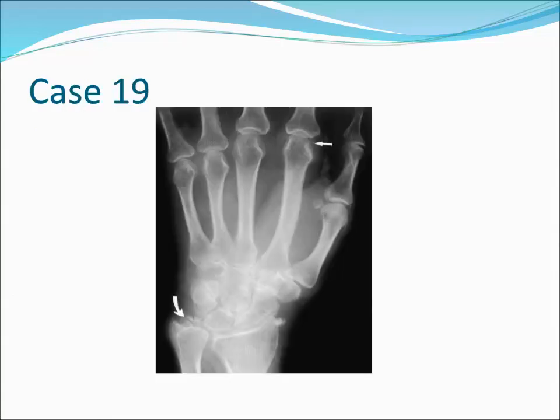Chondrocalcinosis in the wrist. This patient with CPPD exhibits chondrocalcinosis in the triangular fibrocartilage of the wrist, curved arrow. Triangular fibrocartilage calcification is one of the more common locations for chondrocalcinosis to occur. Calcium pyrophosphate crystal deposition disease, CPPD, causes much confusion among radiologists as well as other specialists. CPPD has a classic triad: pain, cartilage calcification, and DJD.